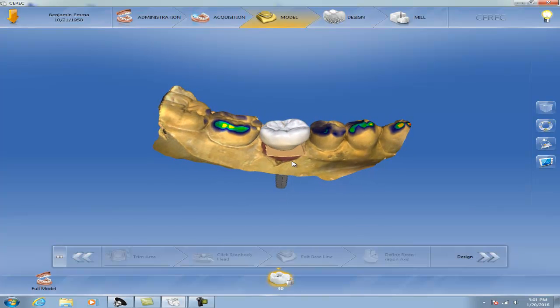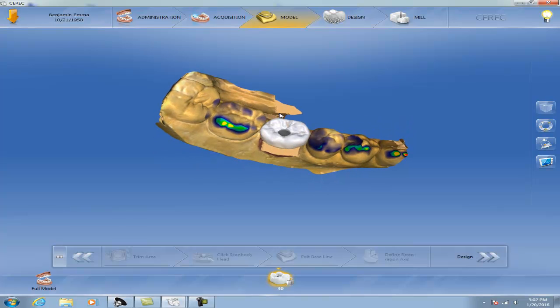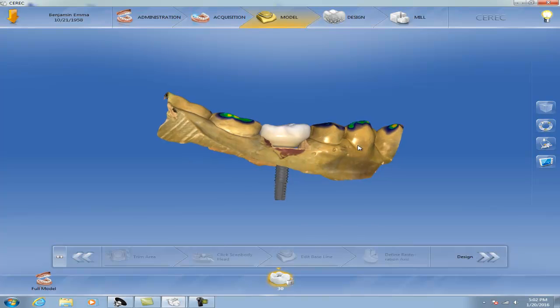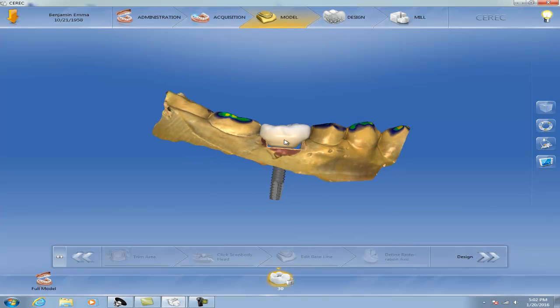The gingival mask I use most of the time when I shape the gum for my future restoration. For example, if I'm going to put a temporary after implant placement, and I shape my gum according to my future restoration, I can copy it and use a gingival mask, so my final abutment will resemble the same shape as the shape I already have on the gums.